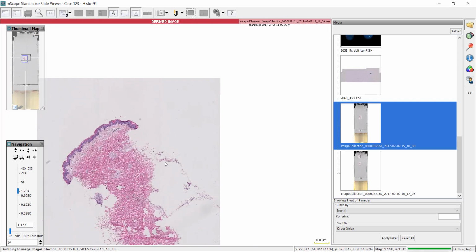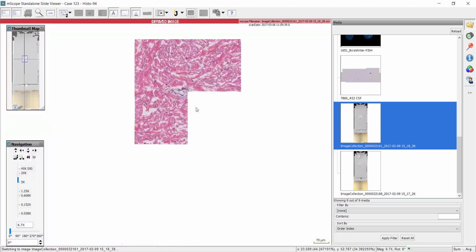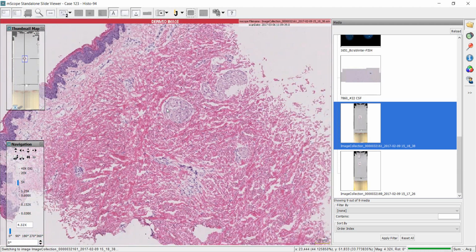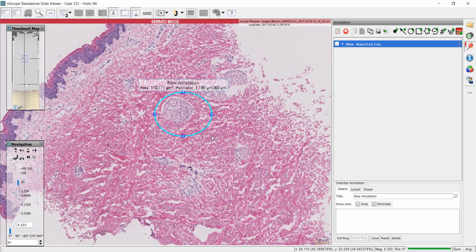And you can see the responsivity of the viewer is quite quick, even though it is a web-based viewer, and the sizes of these files are 1 to 2 gigabytes in size. They are coming through nicely and quickly and crisply. So I can add in annotations here if I wish, give them a name, like region of interest. I can give them a description as well here.